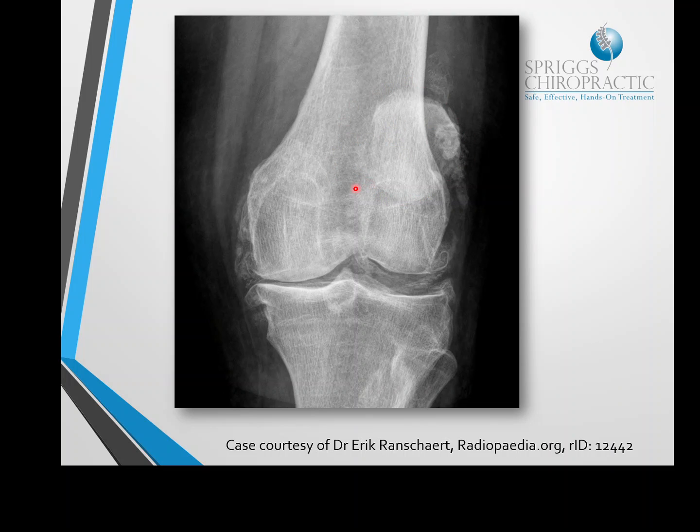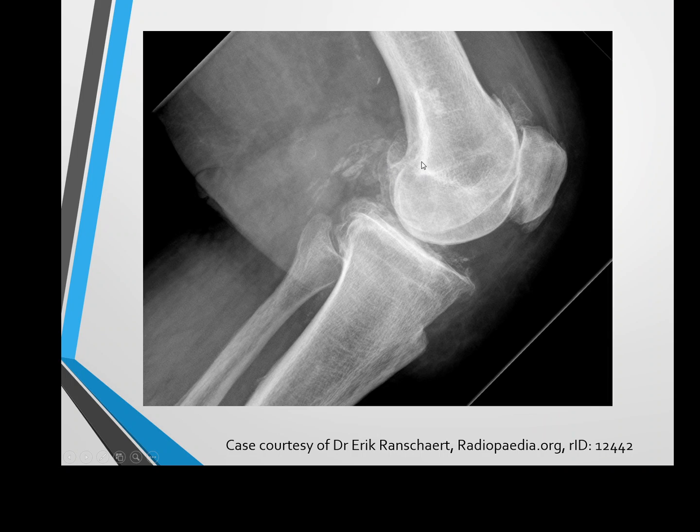Obviously the patella should be somewhere in the medial, in the middle aspect of the distal femur, but here it's translated over quite far to the lateral aspect of the femur. So we've obviously got a subluxation just here, it's really leading to maltracking. And this is the same patient's knee from the side as well. So again, you can see a lot of it posteriorly.